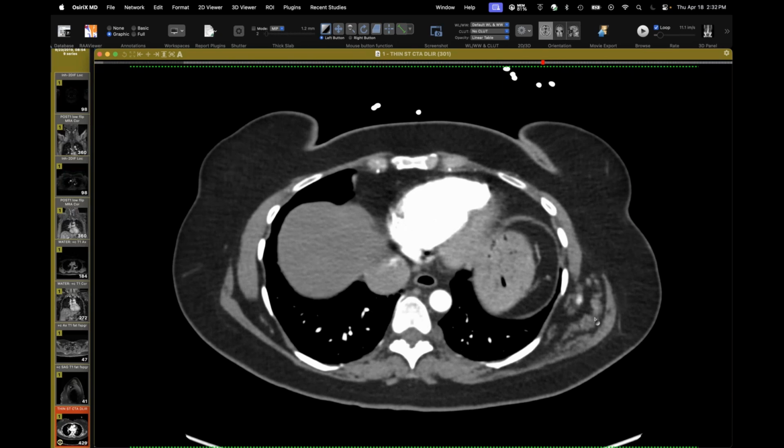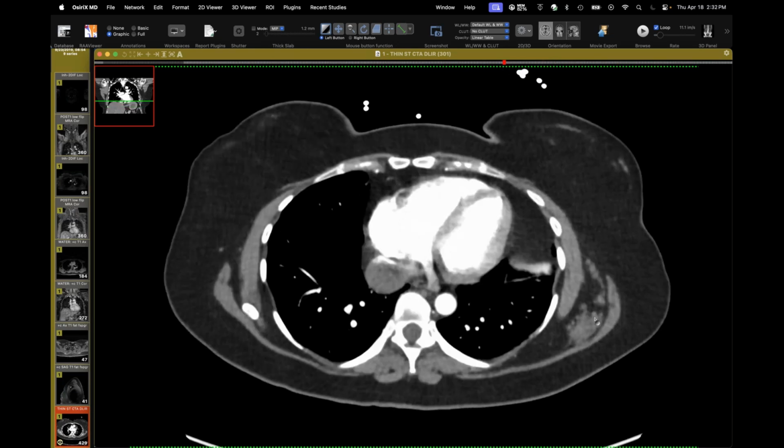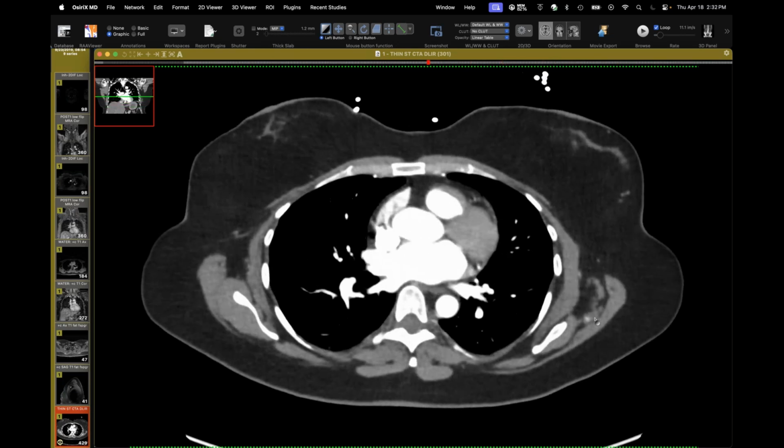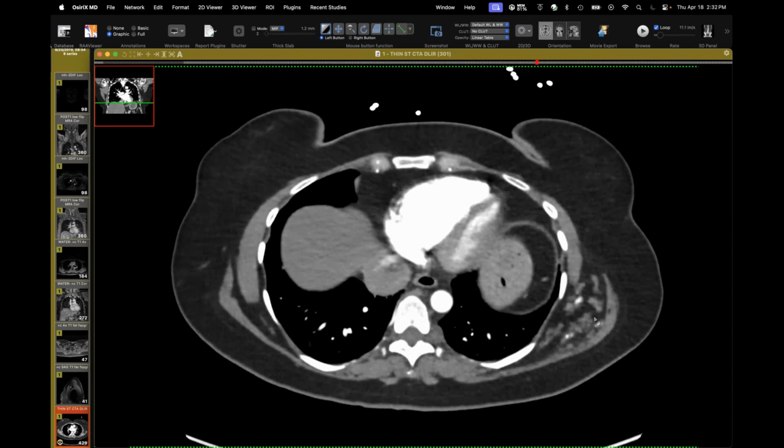MR is a good way to look at them if need be, especially if they're going to decide to treat one. But one like this doesn't really need treatment. I'm not sure why the MR was done at some point, but there must have been some questions. And then they can embolize them depending on what they're draining, if they're causing problems, often in multi-step procedures because they can have a lot of flow. But you can see this one isn't really recruiting any major vessels. It's not like it's a big fistula or a shunt. So I suspect it's coming off some small muscular arteries.